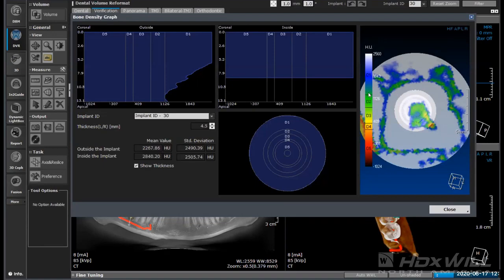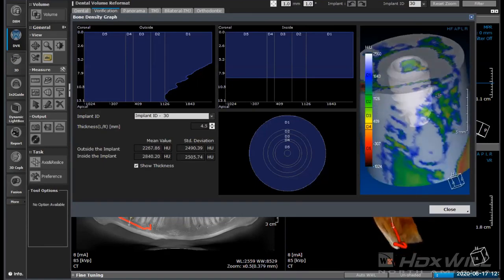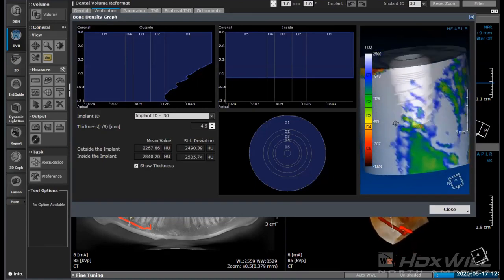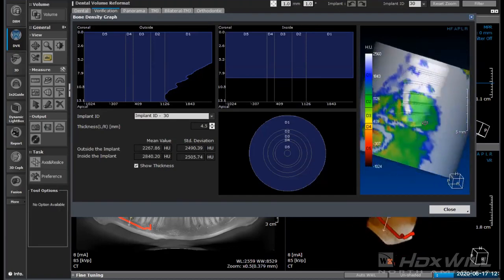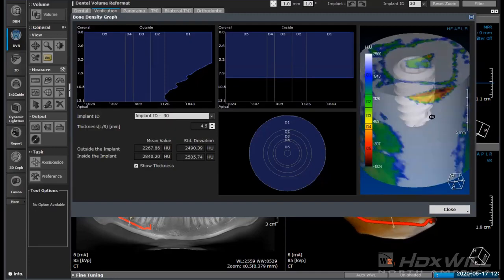So it's very good, very strong bone. And then we can rotate that up. And now we can look at the bone around. Right-clicking on any 3D model will allow it to turn. And so in this case, I can look around and see that it's there.